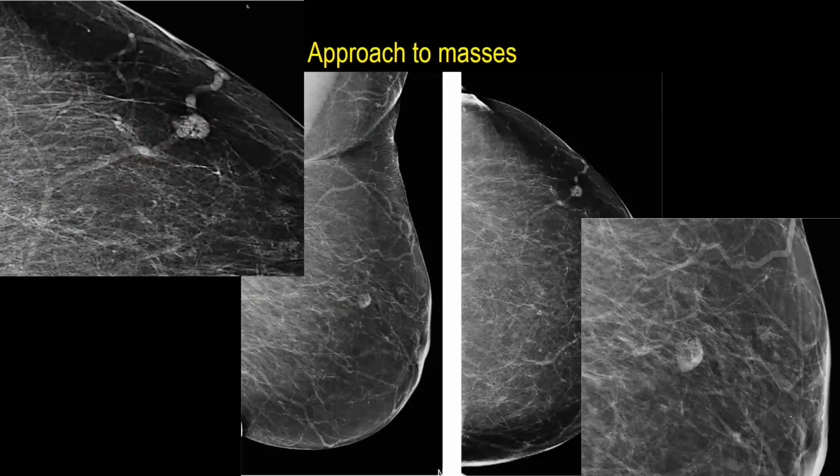Okay, and here, again, the density. Equal density. Is it equal density? This is a magnifying view of this, and this is a magnifying view of this. Okay. High density. Okay. Think again and look carefully.